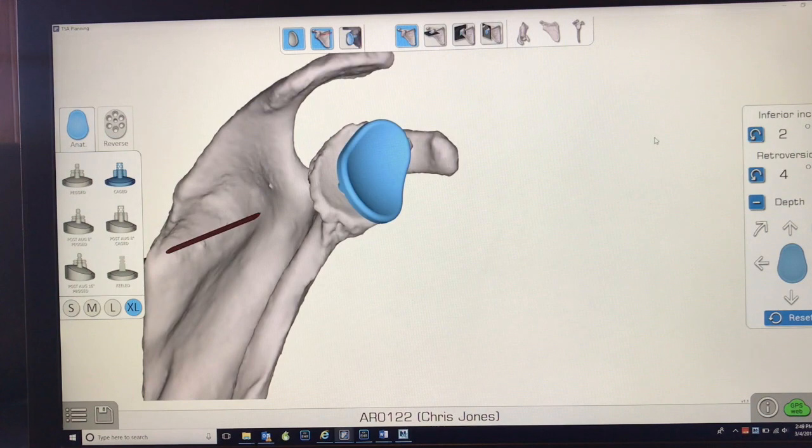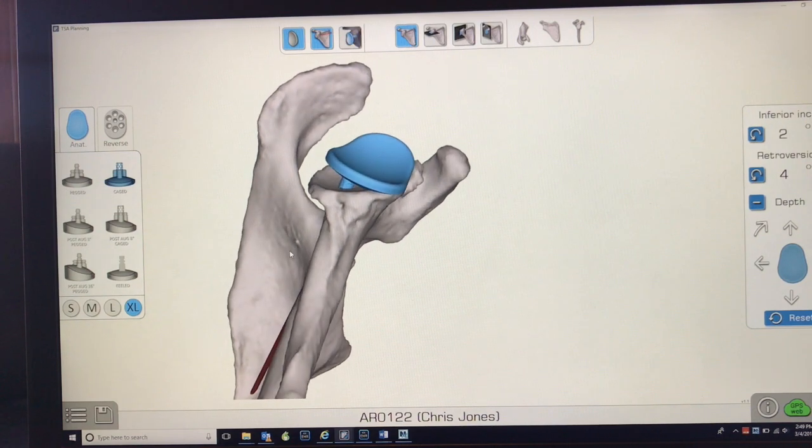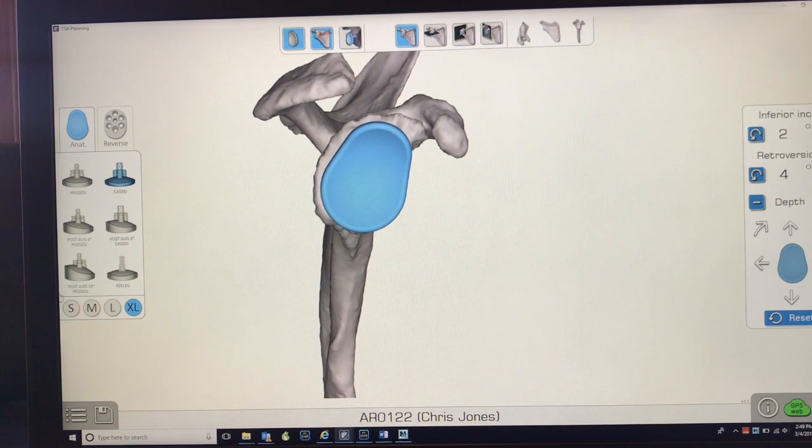If you don't know this going in before surgery, you can look at the face of that glenoid and you really don't know that it's worn, because from the viewpoint of the surgeon, all you see is this, just the face. You don't see any of the scapular body down here. You can't see this coracoid process. The acromion is covered with the deltoid. So really, this is all you see.